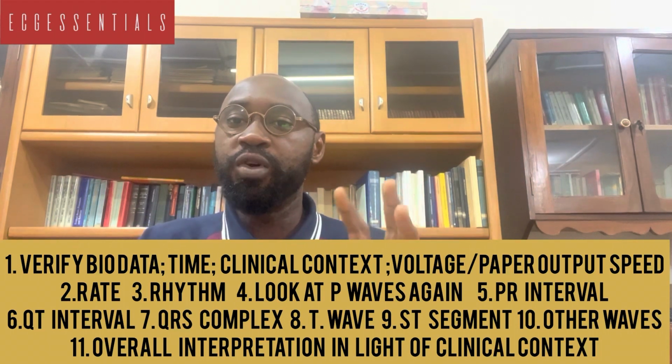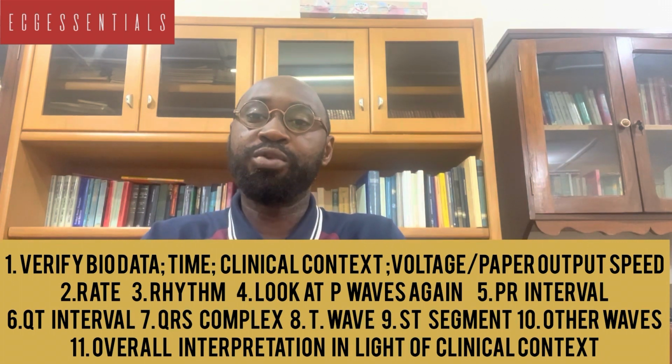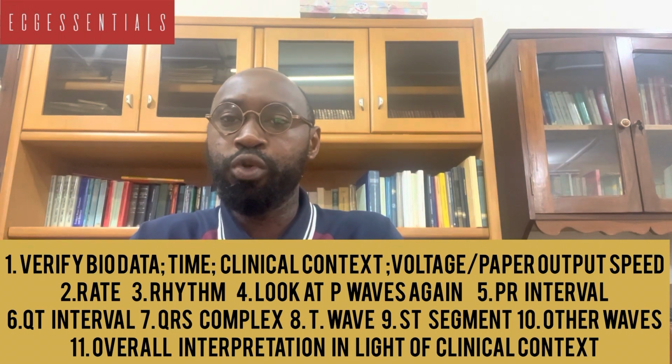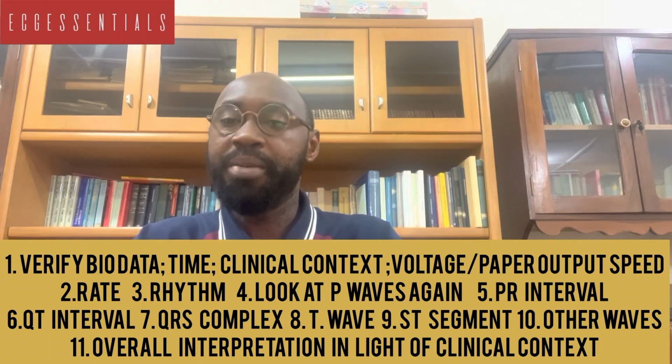When you have looked at these traditional features, then you pay attention to the less common waves that may also be there, like the U wave, the delta wave, the J wave, the epsilon wave, and the likes.